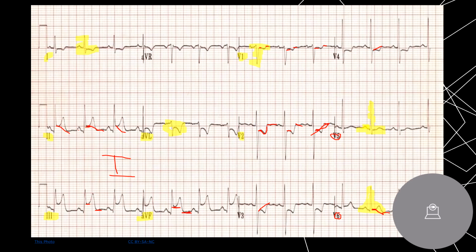Okay, so I had some ST elevation in V6, right? So you could say, oh, it is some lateral, but if you think about why would it be in V6 and 2, 3 and AVF? That's weird. This is the right, this is the left. Well, it's actually at the apex. So if you draw the heart, you would have 3, AVF, 2, and V6 is right here.